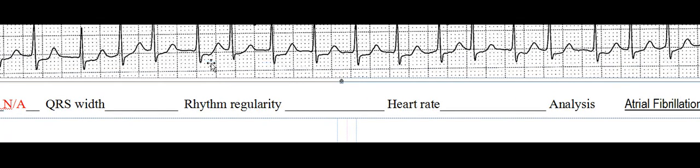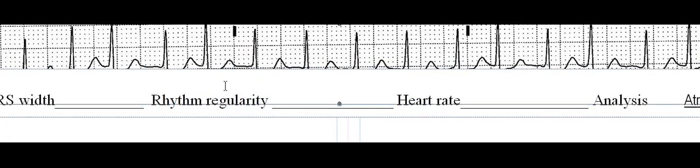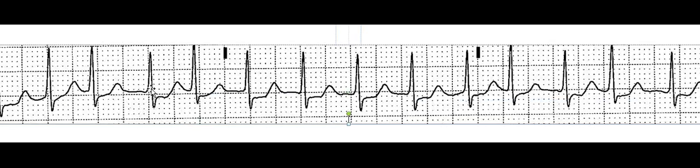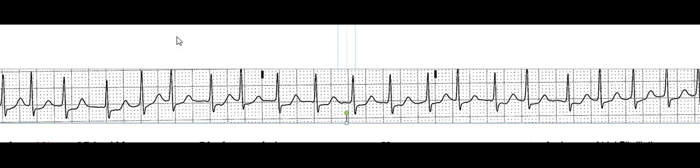All right, QRS width. Again, we can blow this up. All right, this QRS looks like from this line to not quite that line. That would give me about a 0.06. Let's look over here. We find anybody that's lined up better. Yeah, it starts right about at that dotted line. It jumps to about that dotted line. That's about a 0.08. It looks like it's okay. So somewhere between 0.06 and 0.08 is what we're going to say here. Both totally normal numbers.